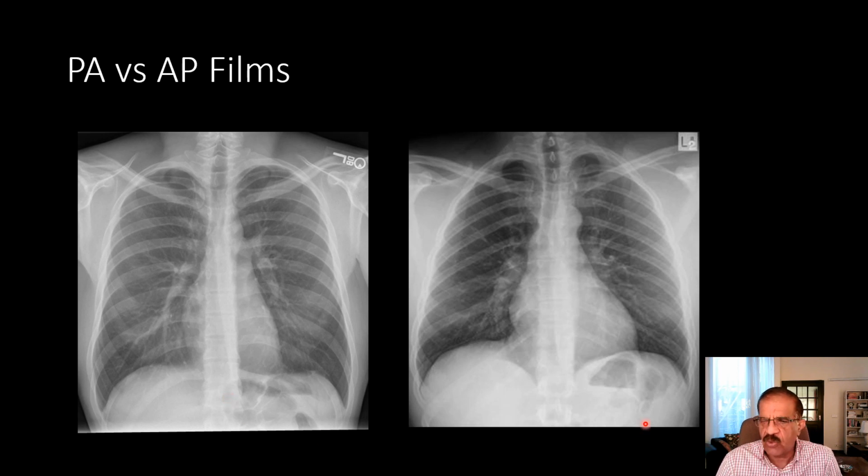Another thing is actually the silhouette, the outline of the heart. Normal heart is just like this one. Now if you trace from above, first you see one prominence which is caused by the aortic knuckle. This is the aortic knuckle, and sometimes you may see calcification here, especially if the X-ray belongs to an elderly person. This rounded shadow is the aortic knuckle.